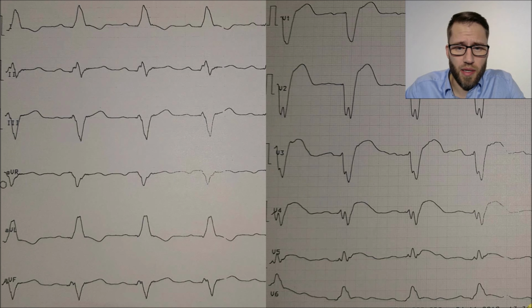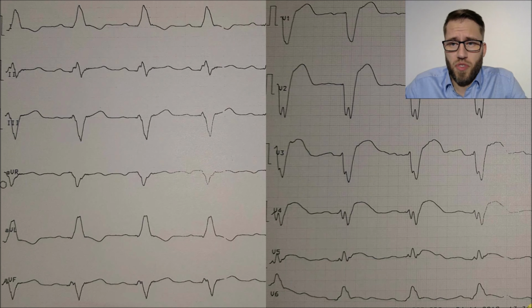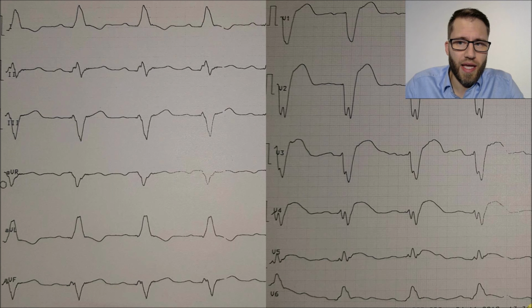You already noticed it's a left bundle branch block, and if we have this ECG pattern, the STEMI guidelines tell us new onset of bundle branch blocks can be treated as STEMI, but very many of us are very conservative if we see bundle branch blocks in patients, because we all know lots of patients have these ECG patterns for months or years even, but this can encode for an acute myocardial infarction as well, and we need to recognize when that's only a normal left bundle branch block and when there hides a STEMI behind that.